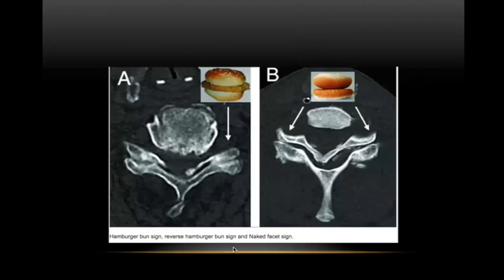Okay, this is the reverse hamburger sign. So when they are locked, so it becomes like a flip hamburger lah macam tu. Okay, by right it shouldn't be like that. It should be on the other side lah. Sepatutnya dia cantik je one after another.